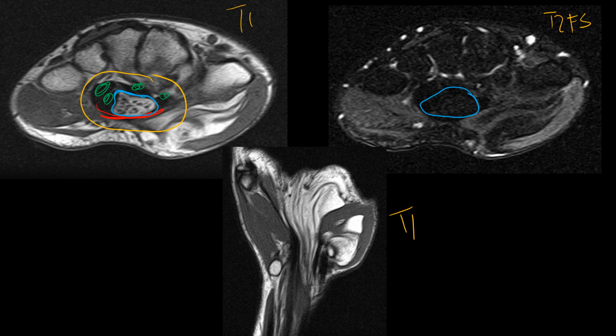So we're thinking about fatty lesions of the nerve, and there are not too many of them. In the coronal images, we see this kind of enlargement of the median nerve when it comes out of the carpal tunnel, and we see these little strands of the fascicles of the nerve. They almost look like spaghetti, which is actually called the spaghetti sign. So these are the findings that we see in MRI, and when you see a median nerve enlargement with fat, you should think about this condition, which is very common on the test.